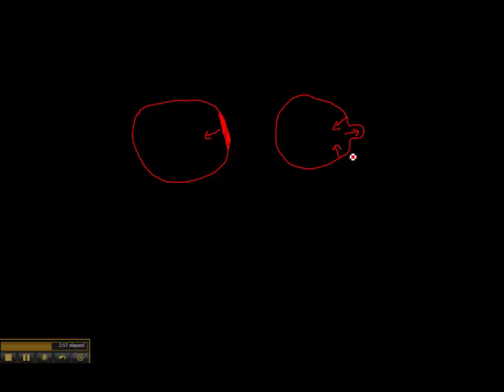Now, that's a bit of an exaggeration, but it bulges outwards when this part is moving inwards and contracting, and that's called an aneurysm. A ventricular aneurysm will give you persistent ST segment elevation. So this patient will have ST segment elevation in anatomically contiguous leads for the rest of his or her life. As I say, I haven't seen it personally, but that would be another example of a great imposter that would mimic MI. So you have to take that into consideration when you're looking at these patients.